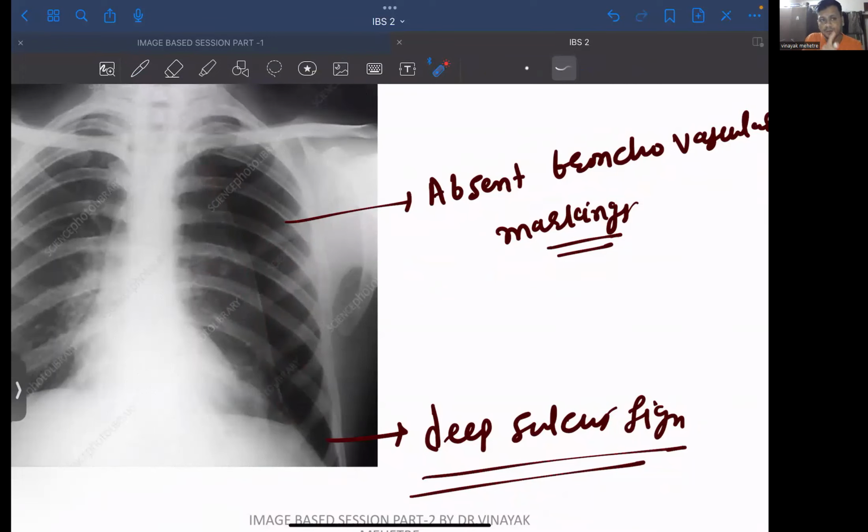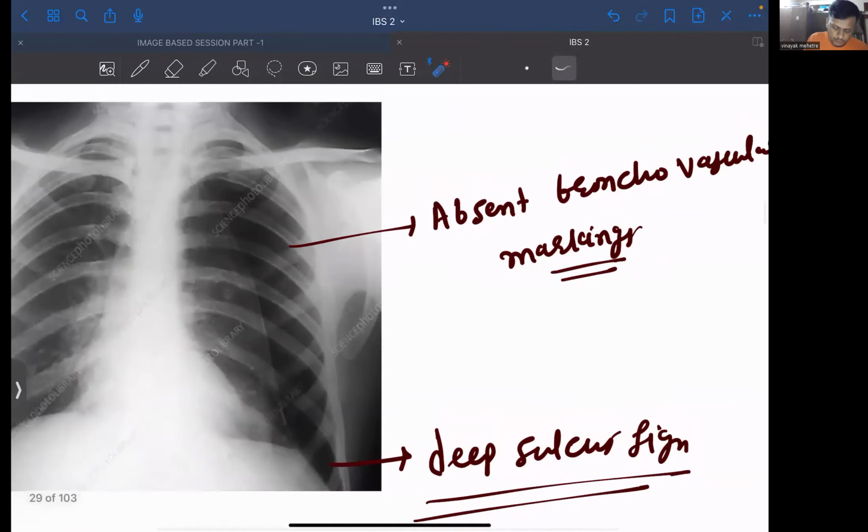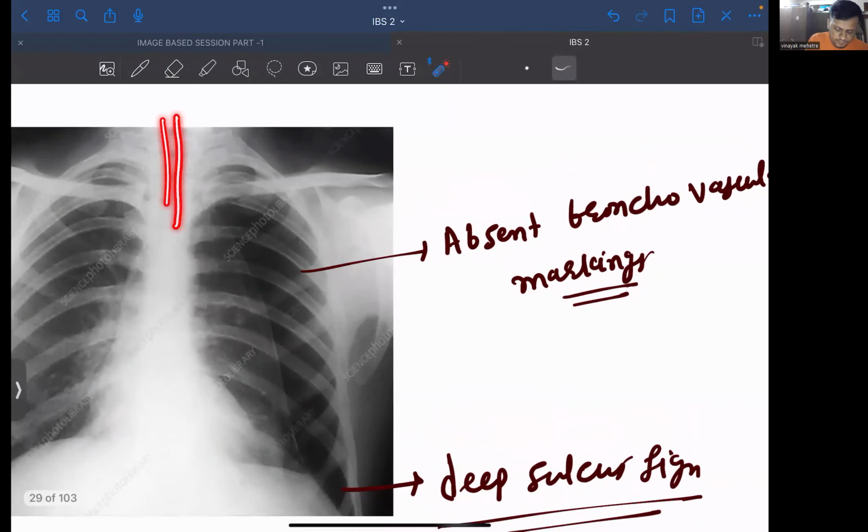And if you have taken a look carefully at the normal X-ray which I showed you at the start of the class, heart is at normal position. So does the trachea. Tracheal ring दिख रही है? So there is no mediastinal organ shift.